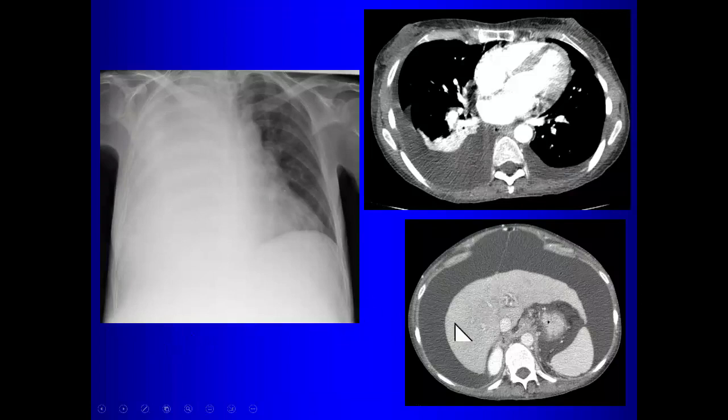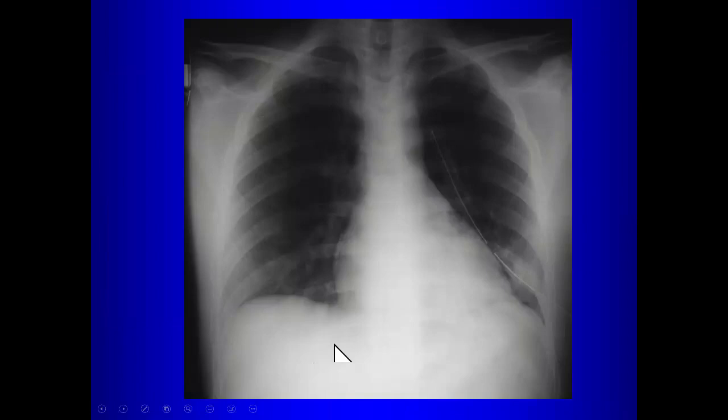So this is a patient who has cirrhosis, who has a large amount of ascites, also developed this large pleural effusion. So what do we call it in the cirrhotic patients who develop pleural effusion? We call that hydrothorax, yeah, hepatic hydrothorax. It's a patient with hepatic hydrothorax, okay?